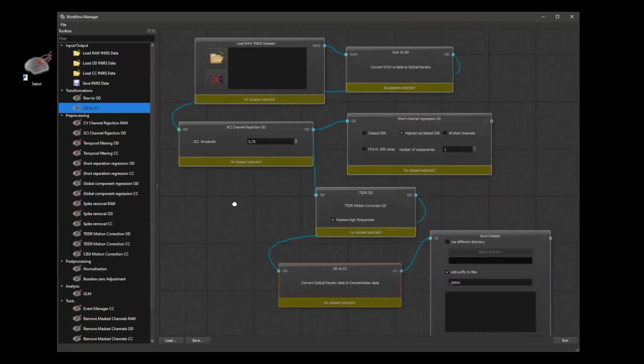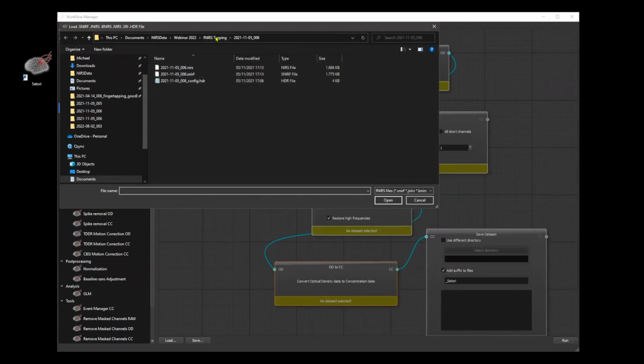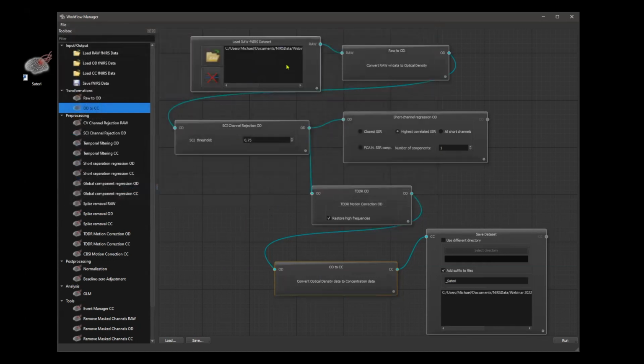Now, which data are we using right now? So currently we have not selected any raw data. So to select one, just open one. And then you can, for example, select the first data set, the fNIRS, just open. And then it will guide you through the whole setting. And here at the end, you will, for example, see the final file format. But you can also store the data into a different folder.